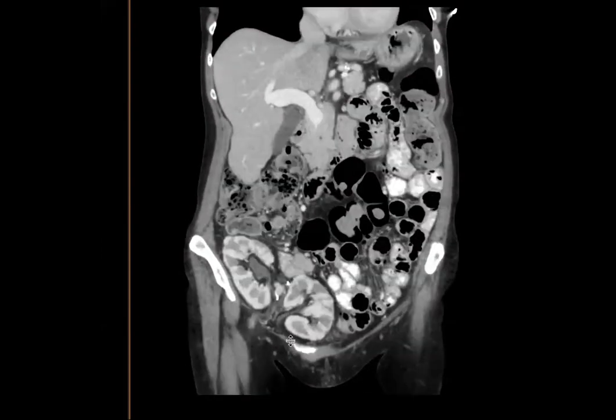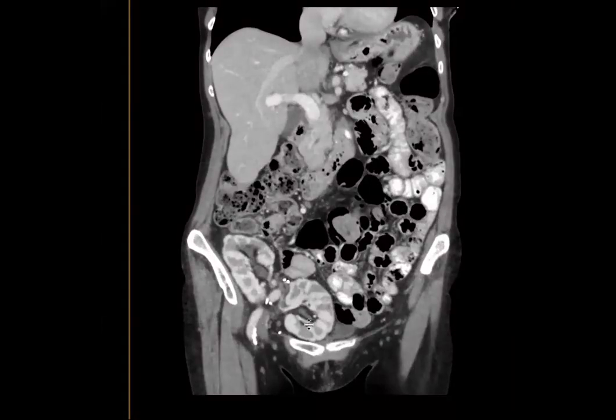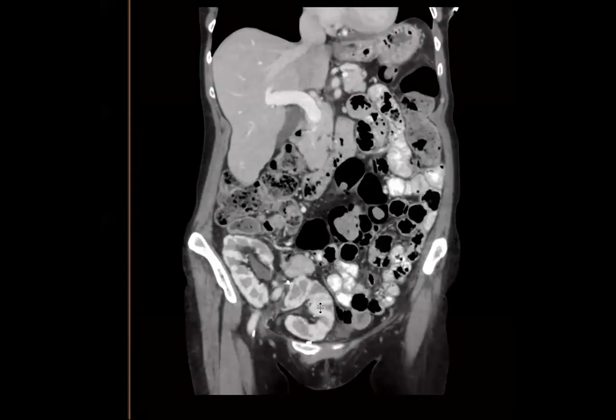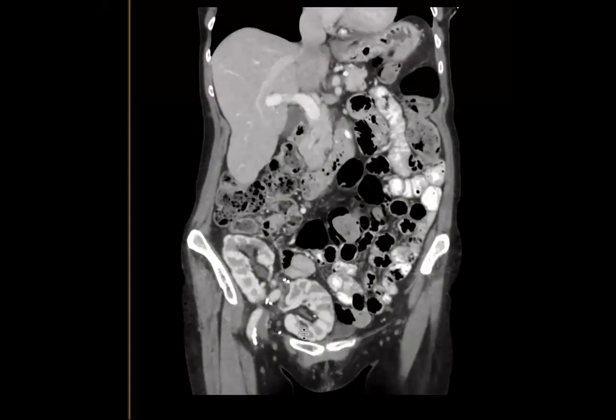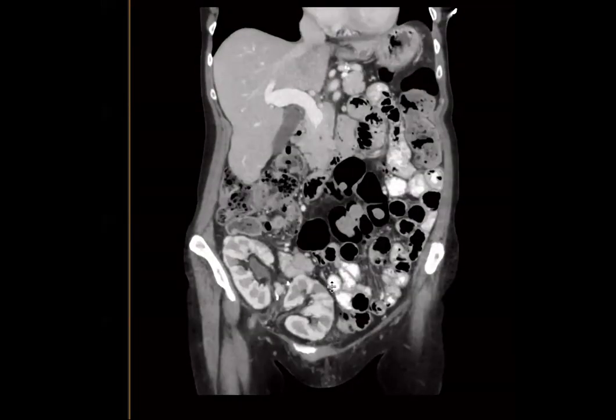So you see some surgical clips, and that kind of indirectly points you to the direction that these are probably transplant kidneys. So indeed, in this adult patient, there are two transplant kidneys in the right iliac fossa. Normally, when you see multiple transplant kidneys, one of them is non-functioning and a new one is transplanted because the one that they did earlier had failed. But here, both these kidneys look like they are beautifully enhancing, they're pristine, and it suggests indirectly that both might be functioning very well. So this is called dual kidney transplant, not single kidney transplant.